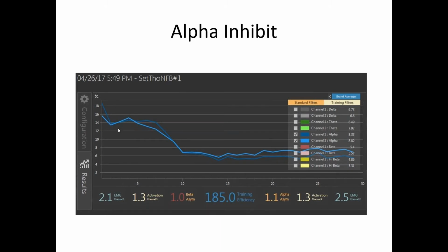So what you're looking at on the trend screen is we're looking for patterns that indicate the brain is accepting an invitation to move in a normative range. If you're selecting a protocol that does not agree with the brain, then you won't see it moving. It's not accepting the invitation. Now, you can force that brain to accept the invitation. You can give it drugs and hammer it. You can do surgery and force it to some degree. You don't know what the side effects are going to be or the long-term ramifications. There's not enough research on planet Earth to tell you all of that, but you can force it, and that's what we've done for a long time.